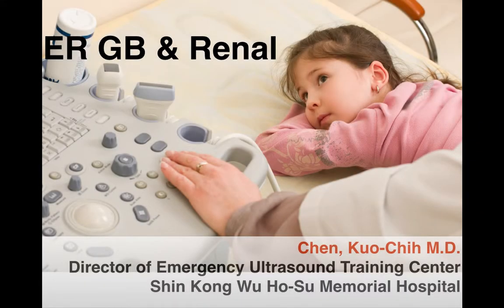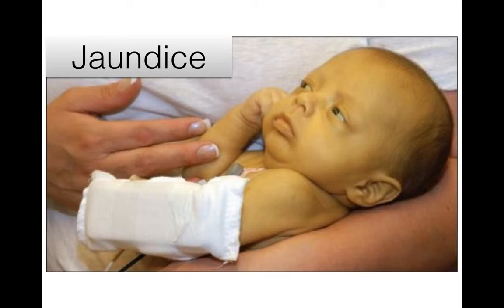Okay. In this topic I will talk about the gallbladder and the general urinary system, because I also talk about the renal, bladder, and the most important, testicle in pediatric patients. Why do we use ultrasound? These pictures demonstrate the indications, right?